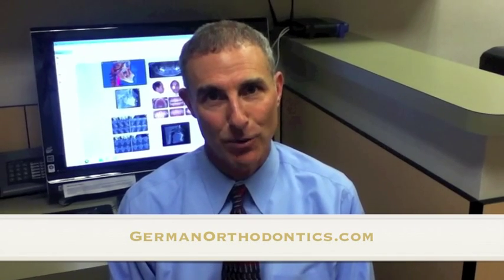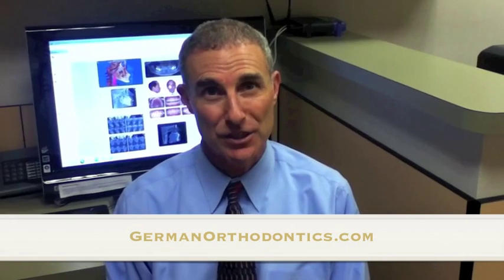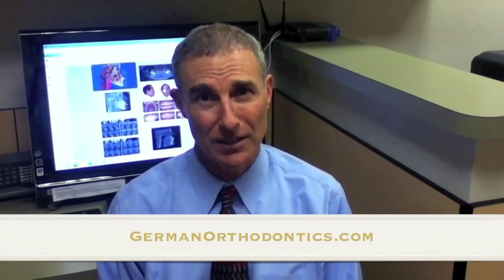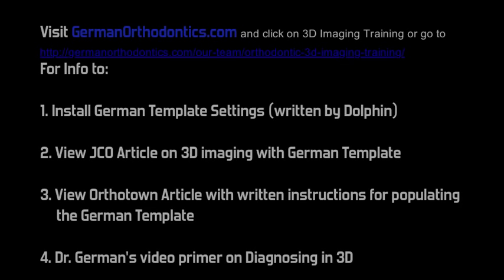Sarah is now going to demonstrate how to take a 3D scan and import it into Dolphin Imaging. She's going to show you how to make all of the images that make up the template that we use for diagnosing in Dolphin Imaging.